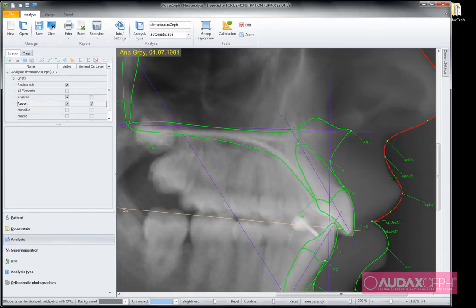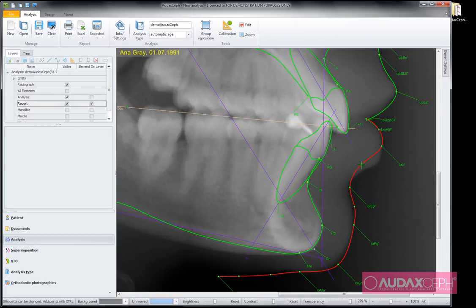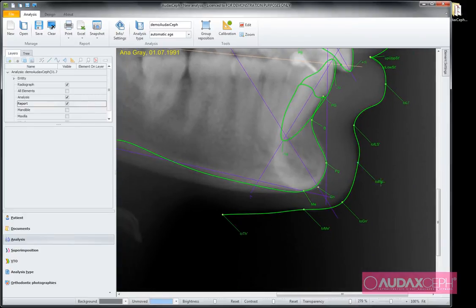I can say, okay, let's add some points, or perhaps here I'm going to put this one here, add a point here, and do this movement. Now let's continue here, and perhaps add some points here. So it is really a nice chin here.